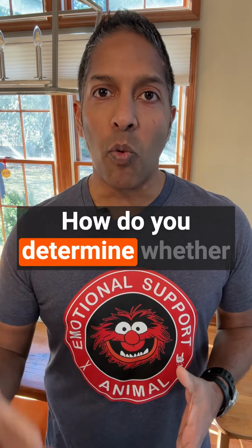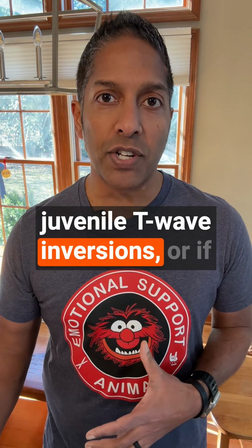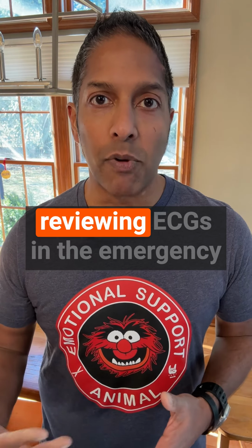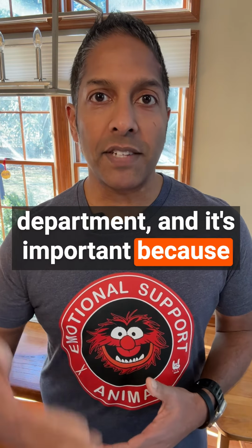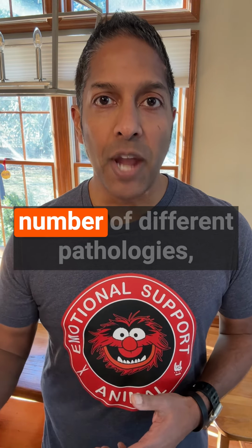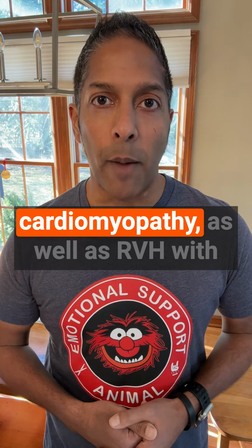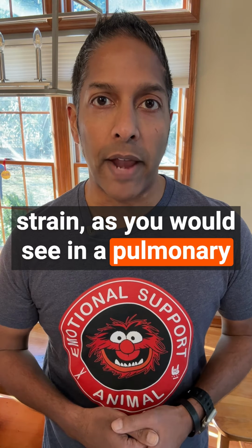How do you determine whether T-wave inversions are persistent juvenile T-wave inversions or if they are ischemic T-wave inversions? This can be really challenging to determine when you're rapidly reviewing ECGs in the emergency department, and it's important because T-wave inversions, especially in those anterior leads, can signify a number of different pathologies, including ischemic changes, Brugada, arrhythmogenic right ventricular cardiomyopathy, as well as RVH with strain, as you would see in a pulmonary embolism.